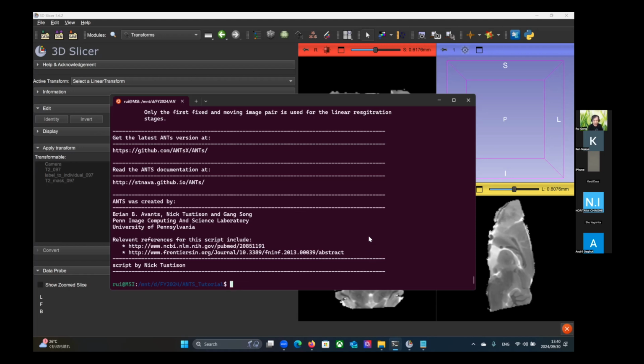Any other questions or comments? Is there an automatic way to rotate all the samples at the same time, just running one command instead of manually changing their rotation every single time?